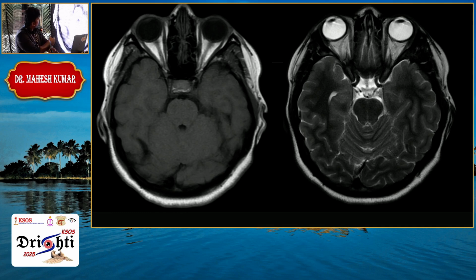This is T1, water appears dark. This is T2, vitreous appears white. And fat appears bright on both T1 and T2. It is slightly iso-intense, slightly not so white on T2, but much whiter on T1. And in the orbit, what is most important to view intraorbital structures is to nullify this white fat signal and make it a fat saturated image.